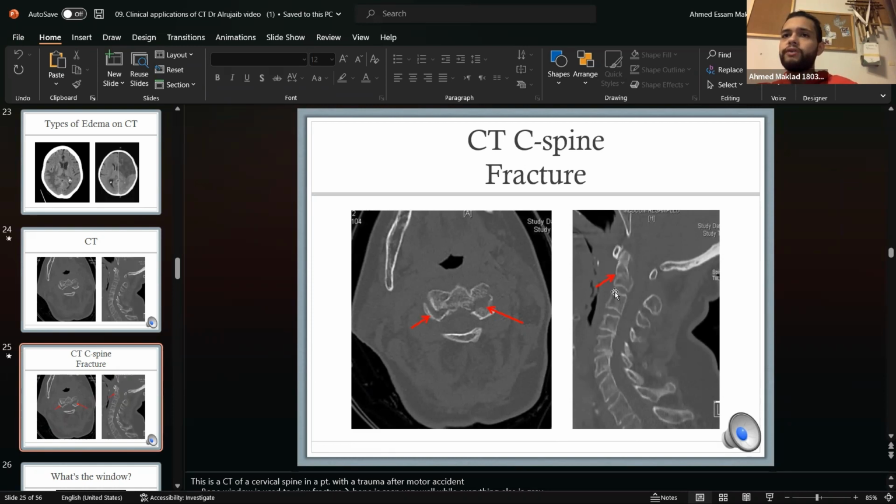All right, so as I said, guys, I think it's too advanced, but anyways, this just shows you a fracture of the C-spine. You can see that this vertebra right here is literally shattered in the middle, all right? I can show you another fracture right here in the spinous processes of the vertebra, but there's nothing really that I can comment on more. The cervical spine, the spine in your neck.